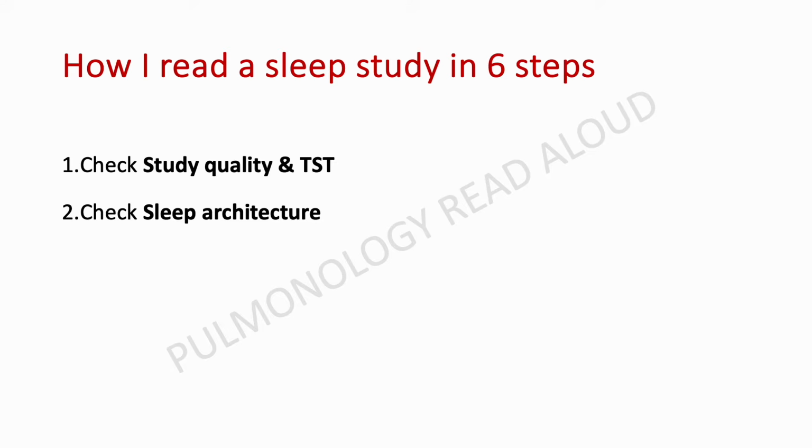In the same format, when I see a report which has come to me for reporting, I would first look at the sleep architecture because a lot of times when you're looking at patients with insomnia, you're looking at patients with COMISA, where you have a combined insomnia and sleep apnea, you may miss out on a lot of things if you don't pay attention to the architecture. Even in patients with chronic respiratory diseases like COPDs and ILDs or asthmatics, when you're looking at the overall sleep of that patient, the sleep architecture is so, so important.